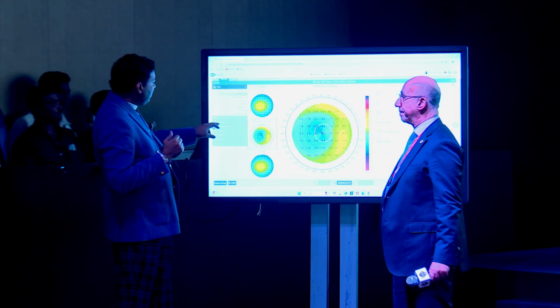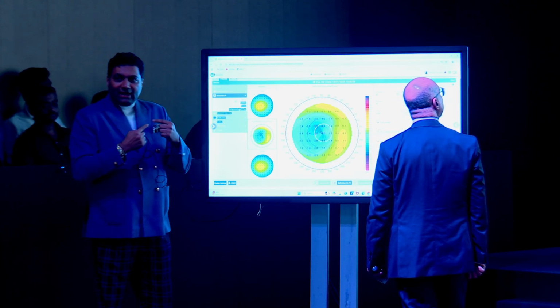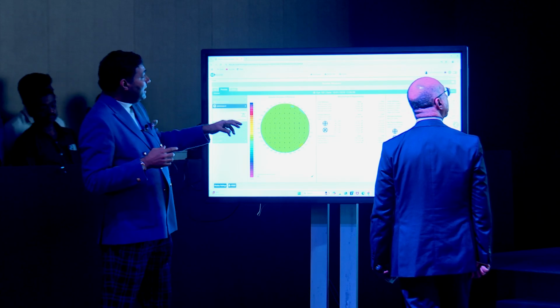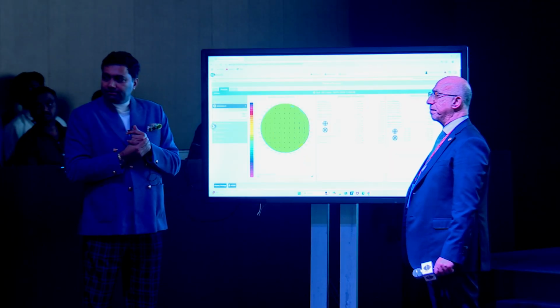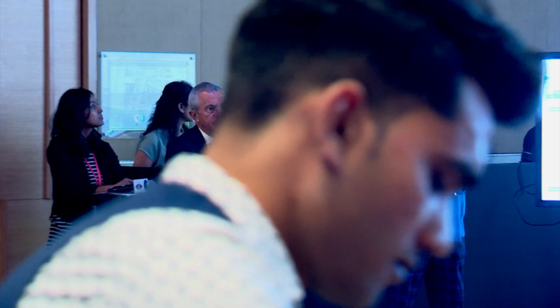6 diopters of change. And if you go to the repeatability, you have to understand that the machine does repeatability every time, so that you are not dealing with something which is not repeatable. For example, the anterior repeatability, 0. How many times does it take the image to do the repeatability? The machine takes the acquisition automatically, because this is required, because customizing means relying on surfaces. So the machine takes the acquisition, and only when all of these parameters you see on the screen are validated is the export allowed.